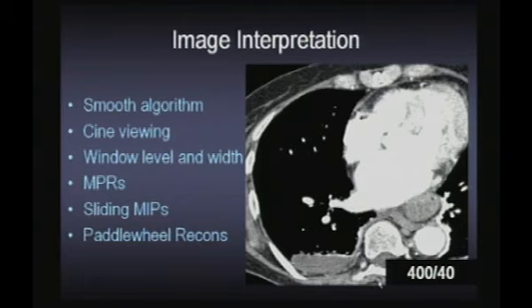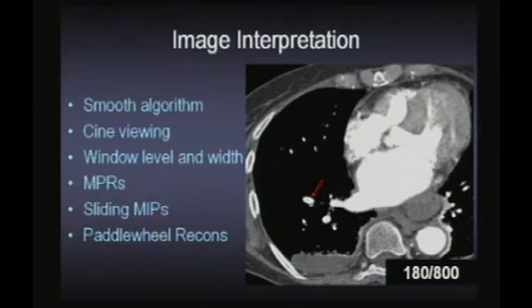We really cannot be prescriptive about the window level and width. This will depend upon the contrast opacification and the size of the vessel that you're trying to evaluate, and you have to dynamically alter these levels as you evaluate the examination.